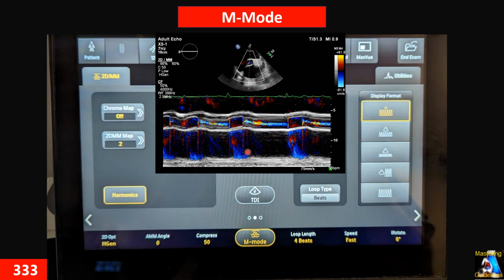For example, here you can see we have a holodiastolic AI, and even in some way you can evaluate the severity, not quantitative, but qualitative, to give you an idea how severe that event is. Especially in those situations where we have some abnormal jet, especially in congenital heart disease. For any abnormal jet, it is a good idea to use color M mode at that jet, and it gives us a lot of information about the cardiac cycle and the timing of that abnormal jet.